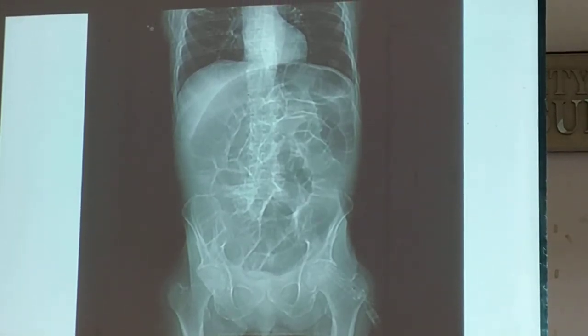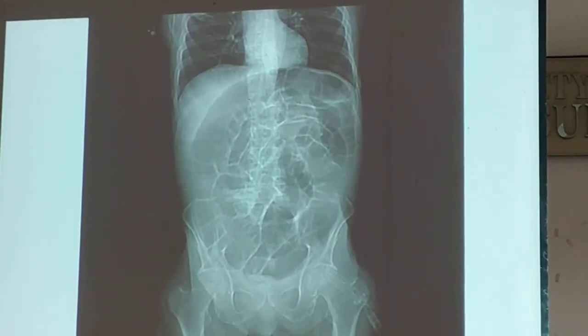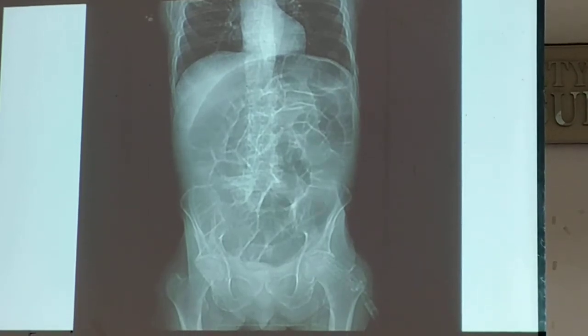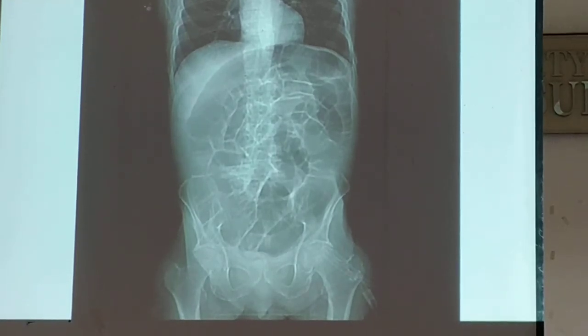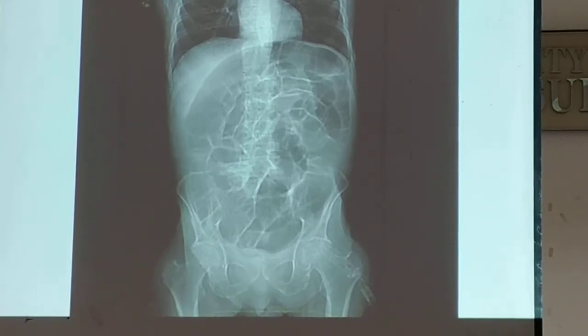With this supine film, you cannot establish your diagnosis of obstruction. For you to establish your diagnosis of an obstruction, you have to do an upright film. Okay?